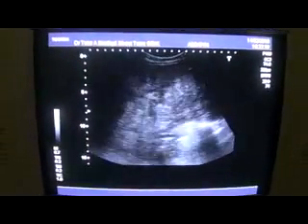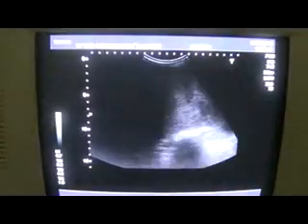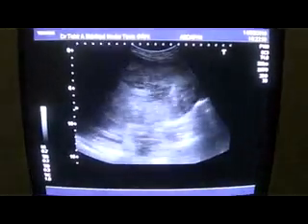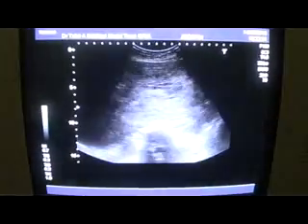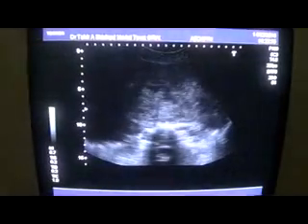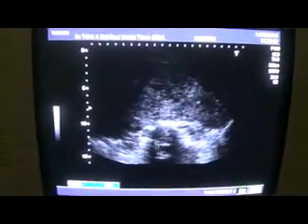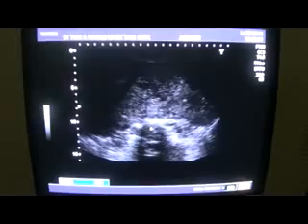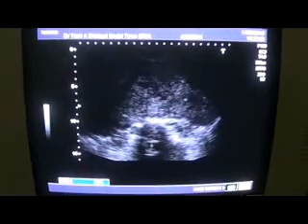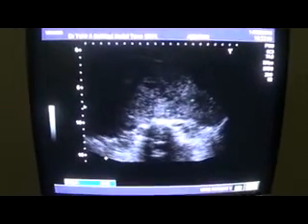This is a calcification. So this is our case of the day of a huge fibroid occupying all of the abdomen. This is the indication that it's extending on both sides of the flanks, that this is the spinal cord, this is the spine, and this is the mass. Thank you very much.